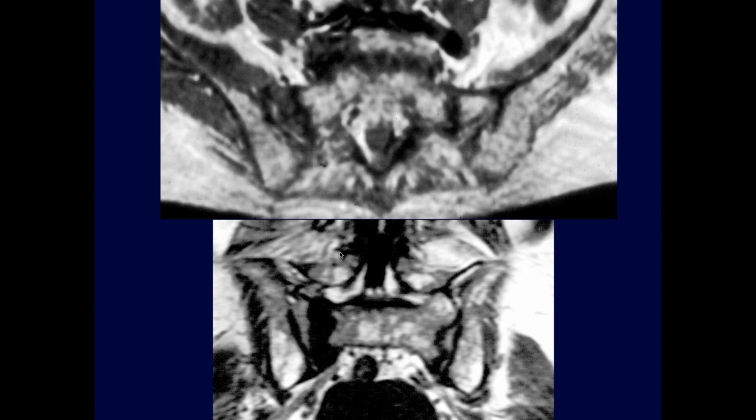So in the MR scan, there's abnormal signal, hypointense signal, like it looks like fracture lines in the bilateral sacrum. Right. Like the back of there and on the axial images. Yeah. See here and here.